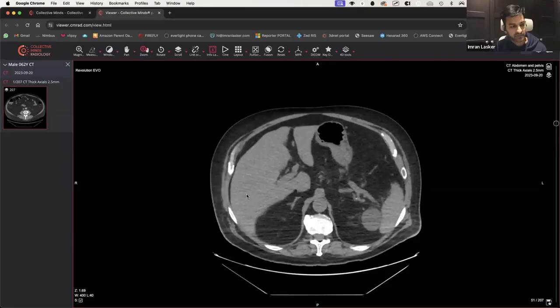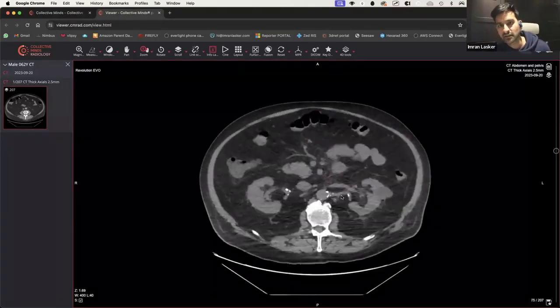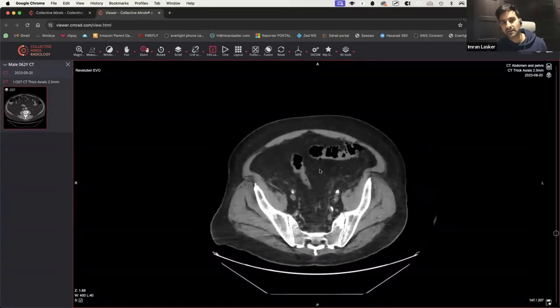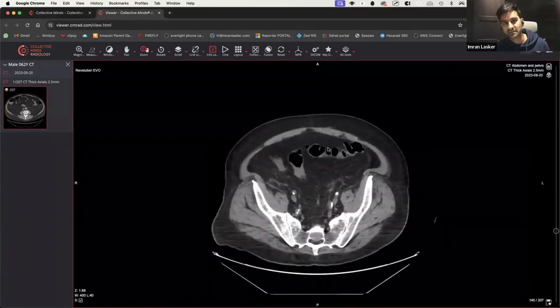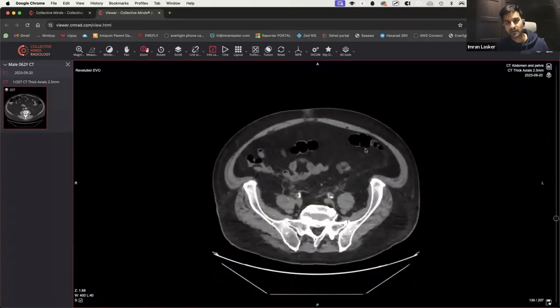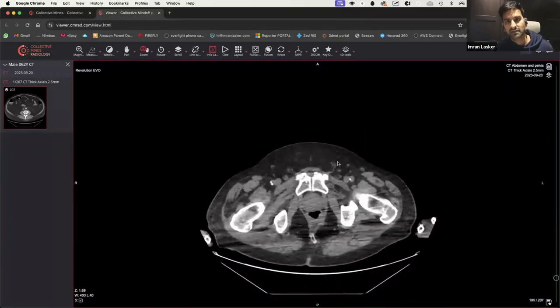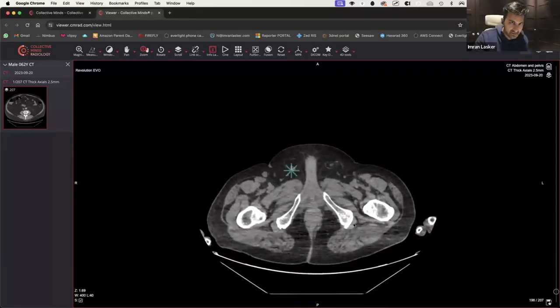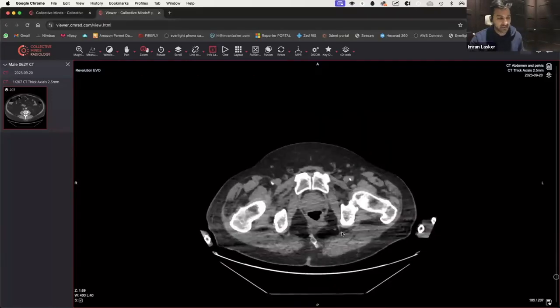So those are all things to do with pancreatitis that I always try to write in my report. Someone said uncomplicated, oh, do you say diverticulosis? Oh yeah, diverticulosis. Yeah, fine. That can be quite common. You can get diverticulosis, those tiny little outpouchings in the bowel, but they don't look inflamed. Interestingly, they do actually have these inguinal hernias, which can contain a little bit of fat, I think mostly on the left side. But otherwise, yeah.